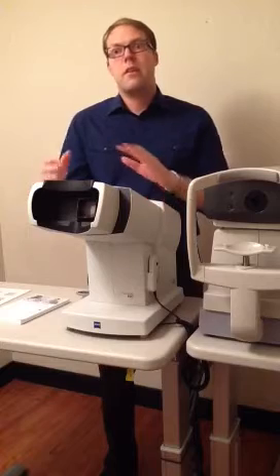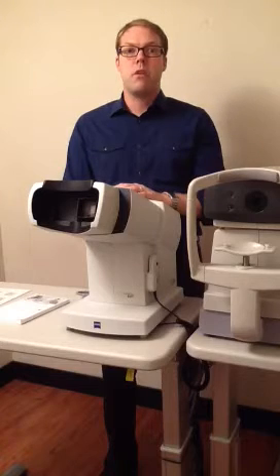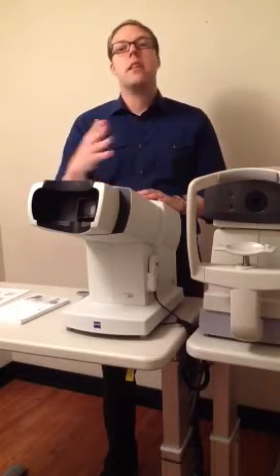And that's very important because if we can catch these things in the early stages, they're a lot more treatable. So that's why it's especially important. From here, we move on to the price. So that's why this machine is very important. It's $15, and for someone like you, and then we move on.